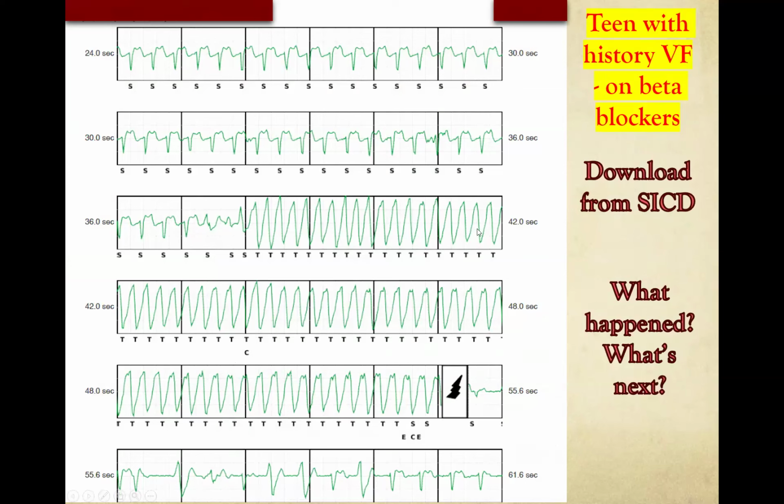And it's very nice because if we look at the VT, there is a tachycardia notation for pretty much every single one of them. So that's a good sign that the device actually was able to sense the arrhythmia during tachycardia, because I think one of the big concerns with SICDs is, will the sensing be good? In this particular case, there's very nice evidence that it is good.